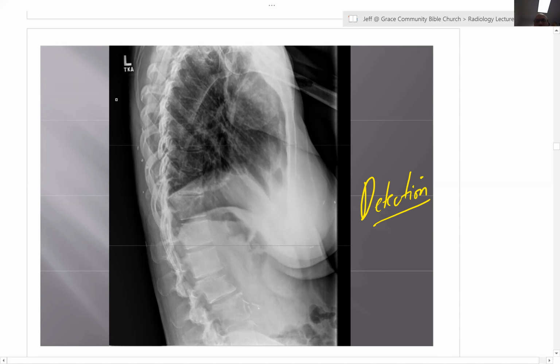Yeah, I mean, look at it. It doesn't look right. There definitely right here is loss of anterior vertebral body height. There is a compression there. Do you guys buy that? Yeah. Now, do you think that this looks aggressive or non-aggressive? Does the bone look healthy or non-healthy? Does not look healthy. Yes, I buy it, and I think even this level, it looks lucent, and then this level, it looks lucent right in here, and then there's a compression fracture, and so I don't like it. I think this looks like an aggressive lesion affecting a couple of levels with probably a pathologic compression fracture.